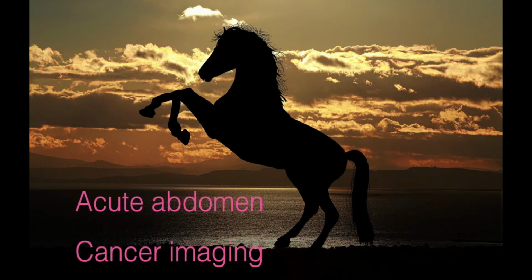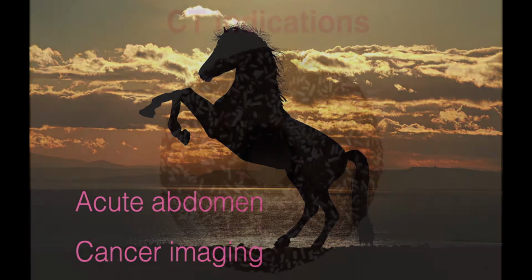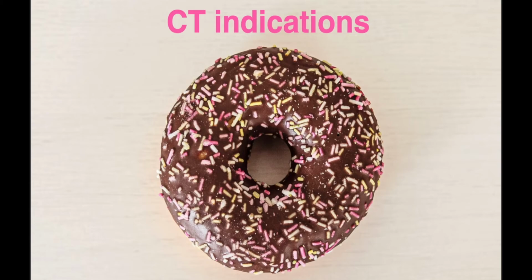But before we jump right into talking about CT, let's take a few moments and try and understand the complementary role that CT plays with X-ray, ultrasound, and MRI. When a patient needs imaging and you are trying to decide the best place to send them, it is helpful to consider the CT donut. Specifically, you need to step back and ask yourself what results you're expecting from an exam and if that result will be sufficient to guide treatment or rule out disease, or if the patient will likely require advanced imaging regardless of the outcome of the study.